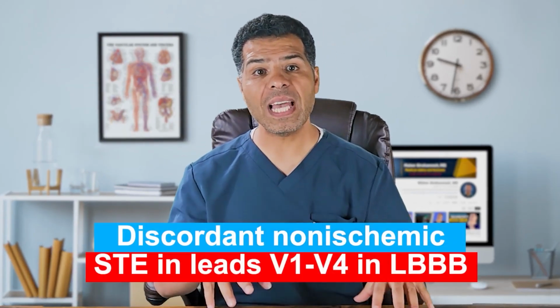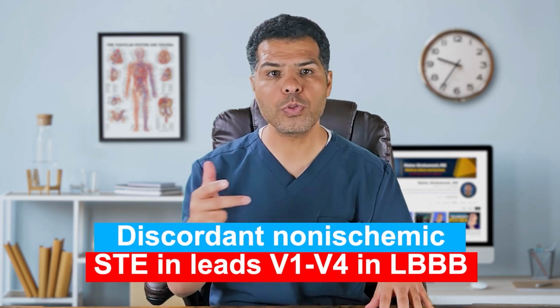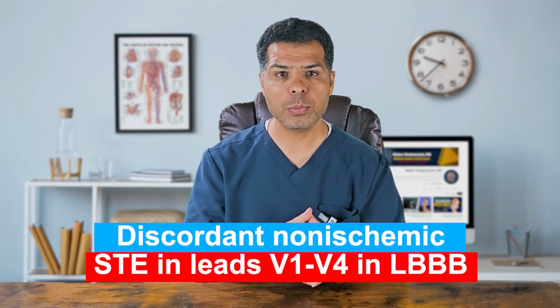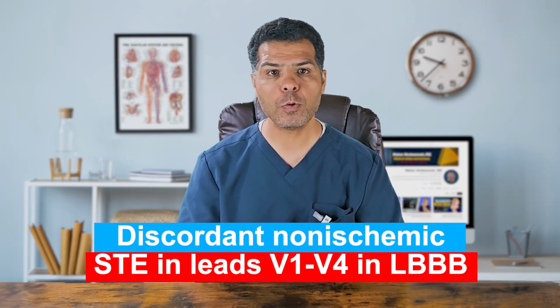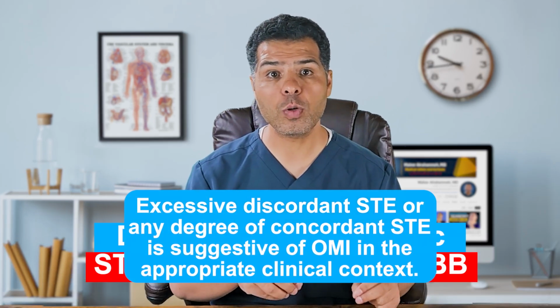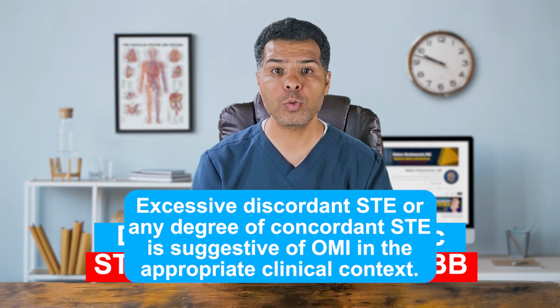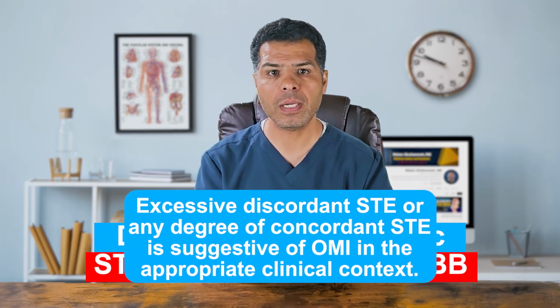This means we will have a discordant non-ischemic ST elevation in leads V1, 2, 3, and 4 in left bundle branch block. This ST elevation must be proportional to the size of the QRS complex. Excessive discordant ST elevation or any degree of concordant ST elevation is suggestive of acute occlusion MI in the appropriate clinical context.